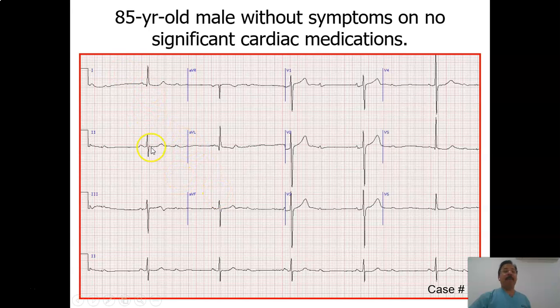Hypertrophy, atria, P wave not very tall, so no atrial hypertrophy. Look at the ventricular hypertrophy, especially the left ventricle. So the deepest S wave in V2: 1, 2, 3, 4, 5, 6, 7, 8. So 8 times 5, 40 mm. So it looks like left ventricular hypertrophy. Is there bundle branch block? No. There are no wide QRS complexes, so no bundle branch block.